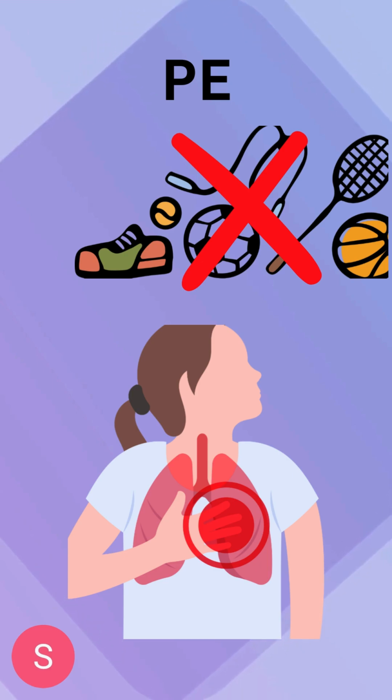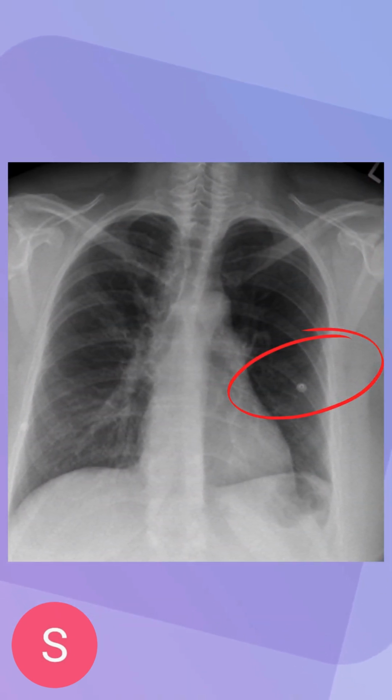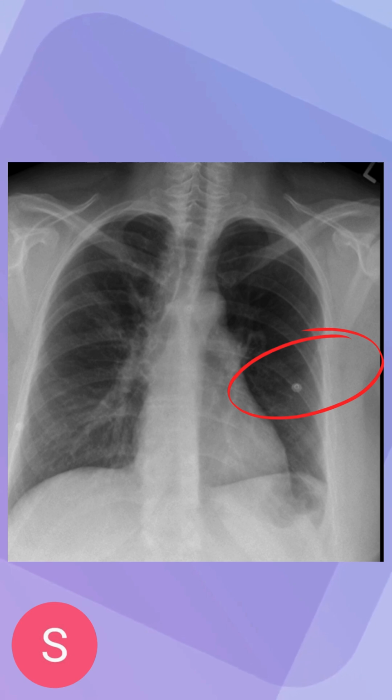We'll take a look at some of the CTs in the next slide, but some of the common conditions that cause it are pregnancy and cancer, and most of these clots form in the leg and travel all the way down to the lung. Now, here's a very easy example, I would say, of identifying a pulmonary embolism.